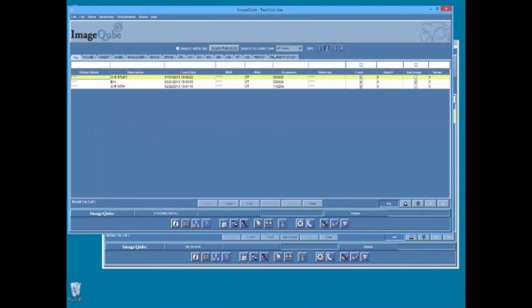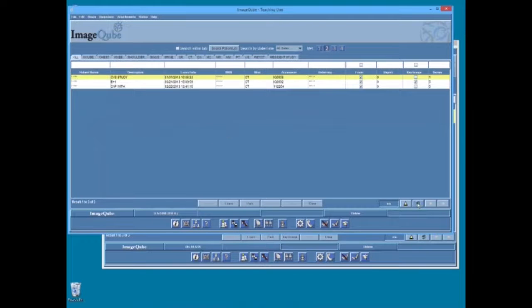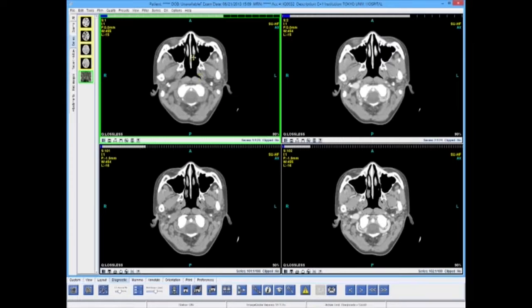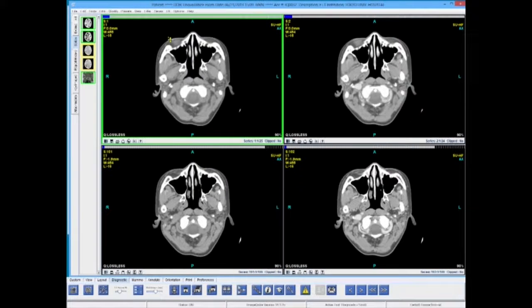Patient name, referring name, medical record number, date of birth, and other pertinent data that must be protected are anonymized. Users may manage their share list by deleting studies at any time. Patient demographic information is displayed as unavailable on the patient list.